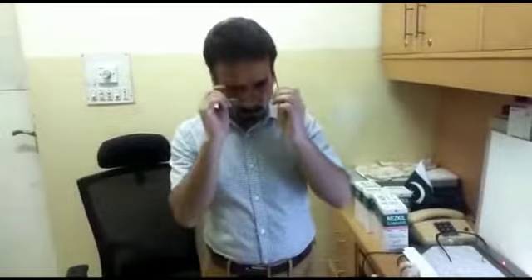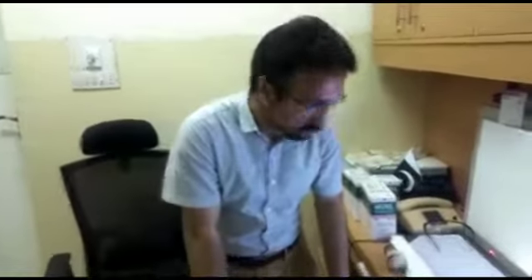I have a patient who has a history of progressive shortness of breath for the last 4 months. He has no previous comorbidities like biomass exposure and smoking. Despite that, he has very obvious abnormalities on the scan, which I wanted you to know in this video. So let's go for the scan abnormalities.